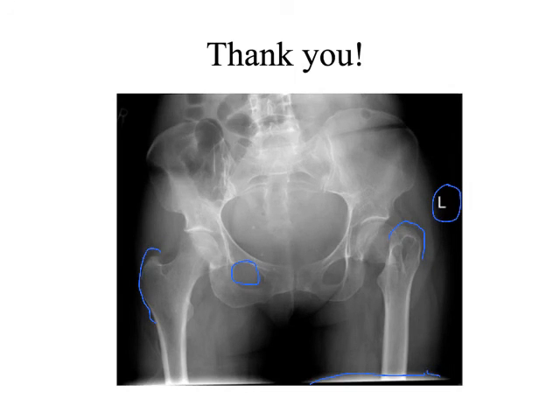Or something's broken. Yeah, it looks like the neck of that femur. It's got something going on, but it's been snapped. Which femur? The left side. The neck of the left femur is broken. So everything that Kathleen said is true. They more or less are trying to maintain this position. They're probably not trying to move their foot at all. She's rotated to the right because she does not want to lay on that left hip, right?